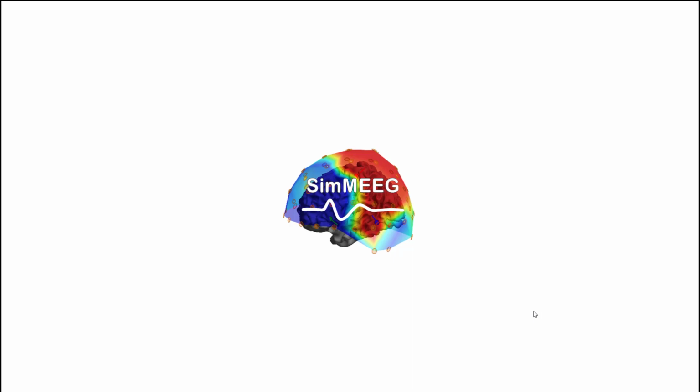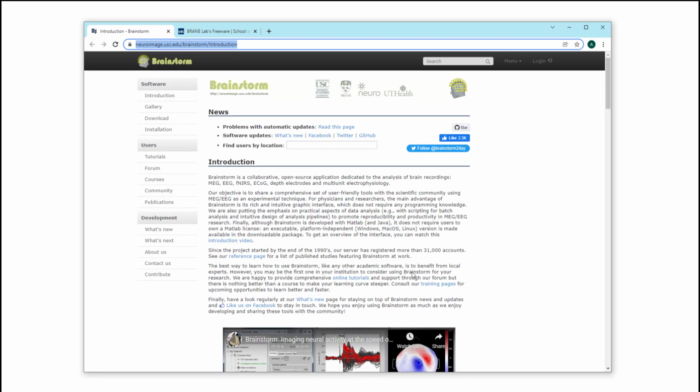Today we're going to be covering how to use SimMEEG as it is integrated within Brainstorm. If you haven't already done so, I would recommend that you download and install Brainstorm and follow some of the tutorials that they have here on the webpage. If you're already a user of Brainstorm and have it installed, if you've updated to recent versions, SimMEEG is actually already installed in there, and we'll show you how to activate that.